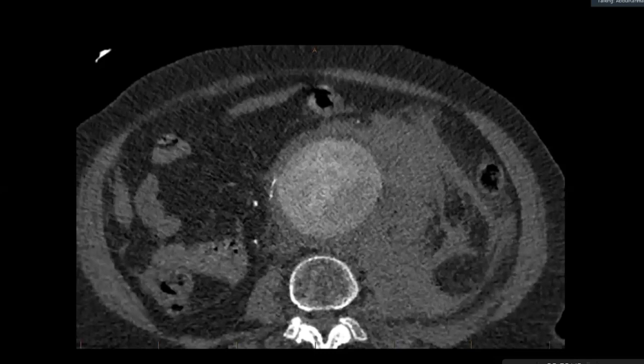You did. Yes, sir. Why didn't you say it? You should have said this is a ruptured abdominal aortic aneurysm. The features are as follows, and then give your description. The examiner might not even want to listen to them. Say, right, next. You want to go through as many films as you can. I knew from you telling me that you know what the answer is. But you did very well.